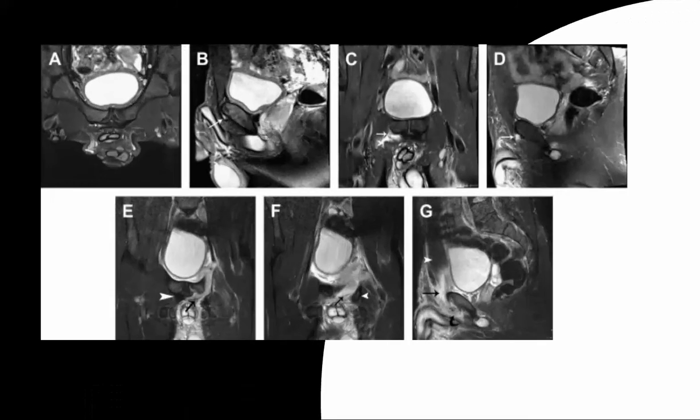So often it's the rectus abdominis adductor aponeurosis injury that's most frequently encountered on MRI. These involve the distal rectus abdominis and the adductor longus origin, and their relation to the pubic tubercle periosteum. And you can see the inflammation quite clearly on MRI. You can get interstitial tearing of the rectus abdominis insertion, and you diagnose these by using asymmetry as your tool, looking at left versus right. So let's have a look at what they look like.